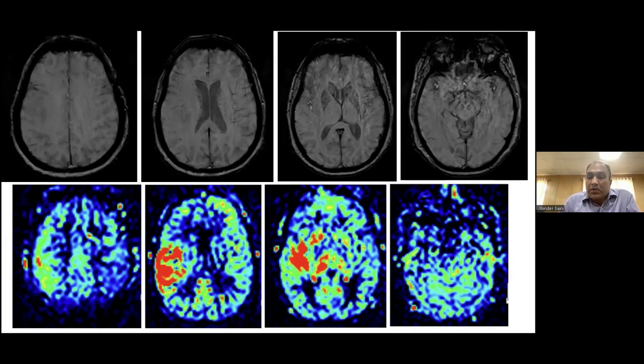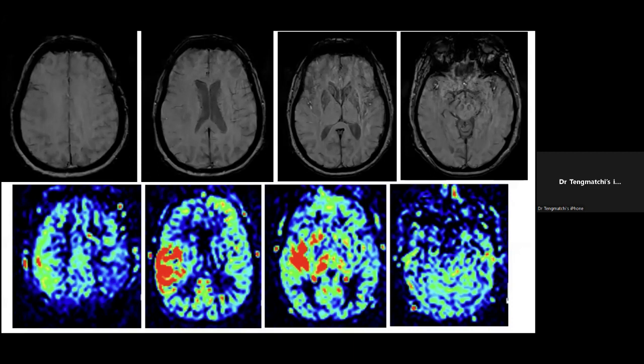They can also show hyperperfusion and can mimic a tumor. So these are the problems we face, and sometimes the answer lies in the imaging, and sometimes we can just wait for some time, because a tumor will tend to grow rather than regress on its own, whereas these signal changes after a seizure, or in autoimmune encephalitis, can actually settle down a bit.